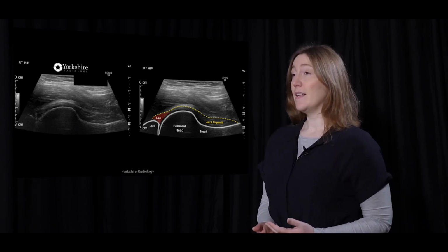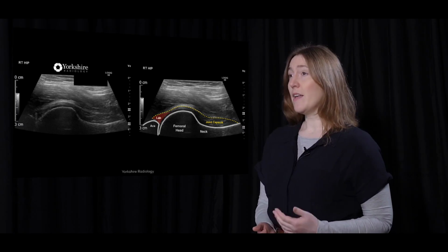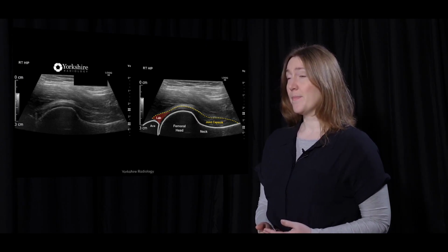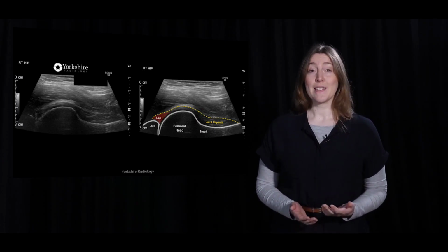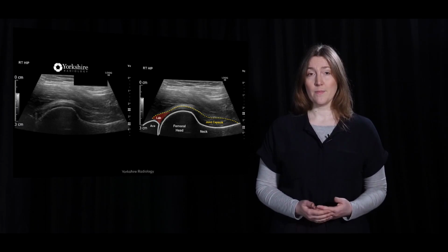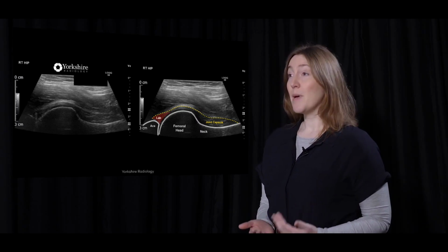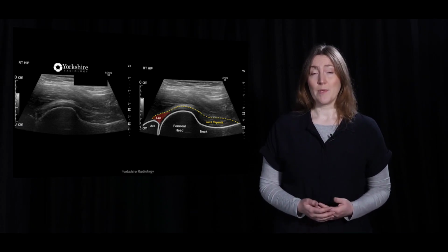If it can be seen, like on this slide with an example of the hip joint, the synovial capsule appears as a thin hyperechoic layer, hard to differentiate from the adjacent tendons and ligaments that have very similar echogenicity. The hip capsule is one of the thicker synovial capsules and therefore a good example of what a capsule would look like if you are able to visualise it with ultrasound. Just as in the bursa example, if a capsule is pathologic and contains a joint effusion, suddenly it's much easier to see the capsule. This can also be seen in the next example.